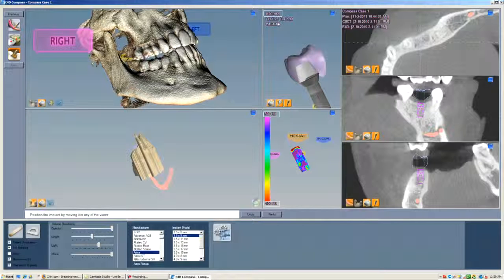And you can see now it's giving me these dimensions so that when you want to select your abutment, you can use these dimensions to make your optimum choice. Or you may need to customize it. That's up to you. You can also angle it over, Alex, and I can rotate this. Very nice. So if you needed to do an angled abutment, I'm just left mouse button clicking along the bottom of the implant. You can see it's just rotating it around.